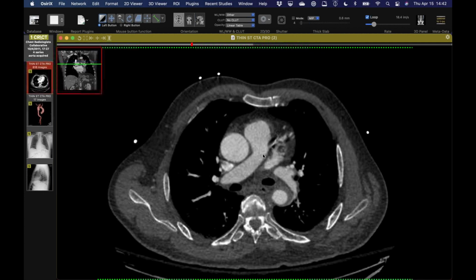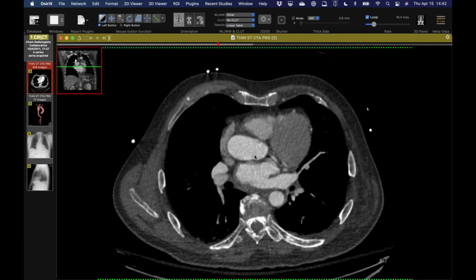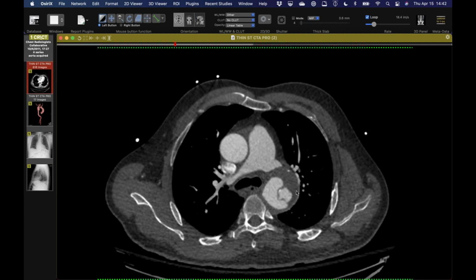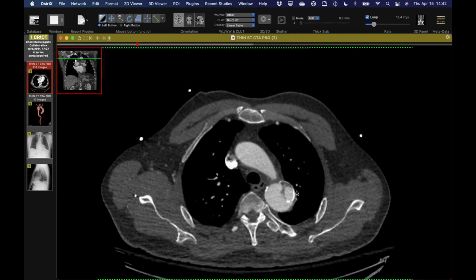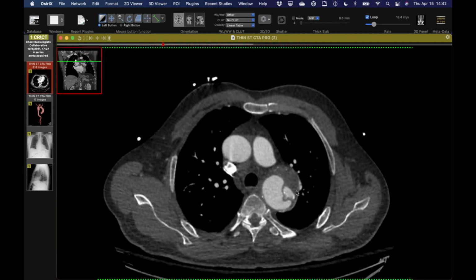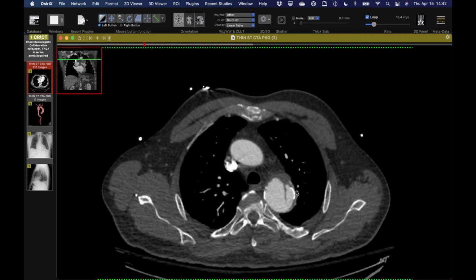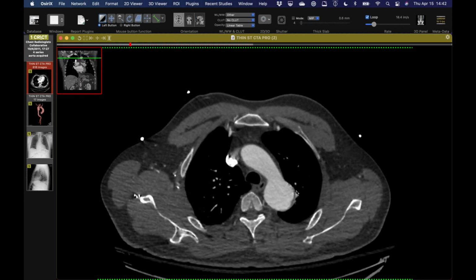And you can see there's this really odd aneurysm just after the takeoff, or right there's the left subclavian. So right at the takeoff of the left subclavian. And then there's what looks like a dissection. There's a flap in here. And you can see there's the calcification of the intima, and there's what looks like a thrombosed portion of the aorta with this.